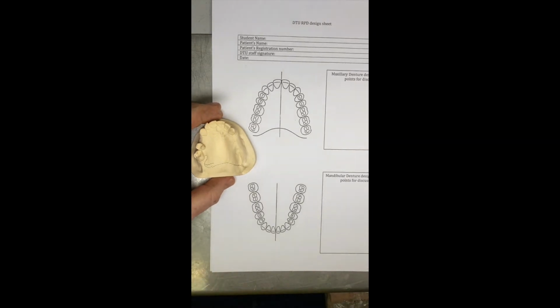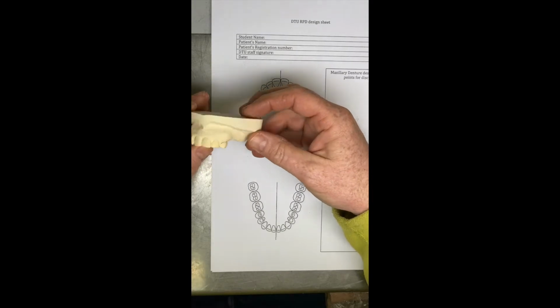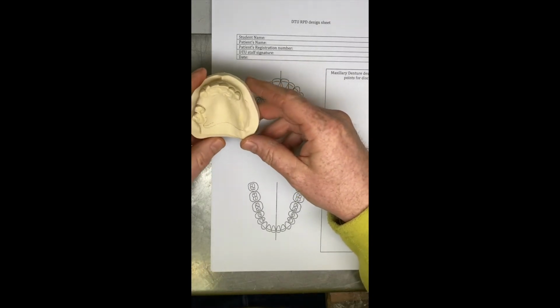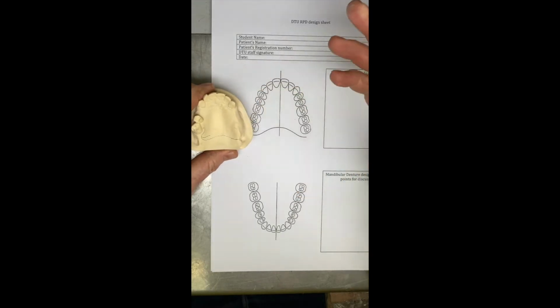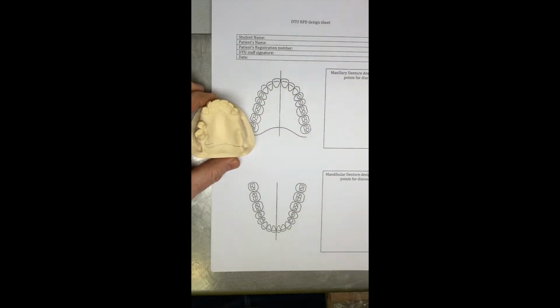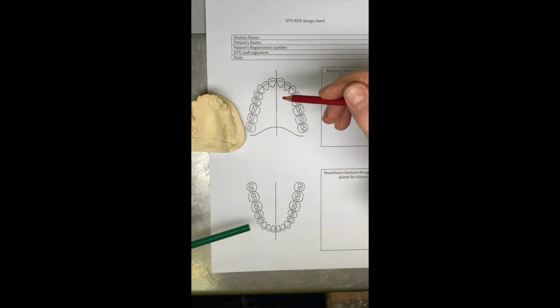Okay, model number 5 then. It's just a standalone model, I haven't got the opposing model for it. I've incorporated this one because it has a bounded saddle and a free end saddle, so I thought it was good in that it allows us to use both rules, if you like.